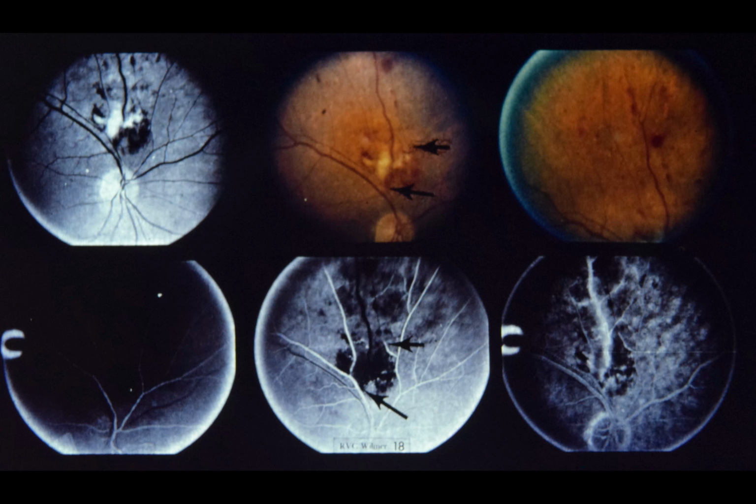Slide 18. Branch retinal vein occlusion with secondary branch retinal artery obstruction. This 61-year-old white female complained of intermittent blurred vision in the right eye for 1 year. Her referring ophthalmologist found an inferior nasal field defect and arteriosclerotic changes in the retinal vessels. Her symptoms worsened despite visual acuity of 20/20.